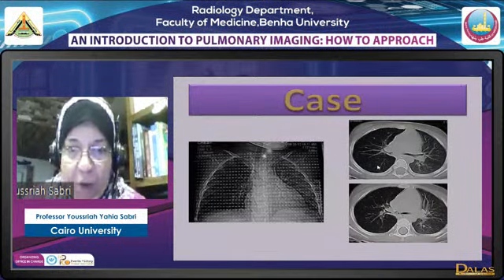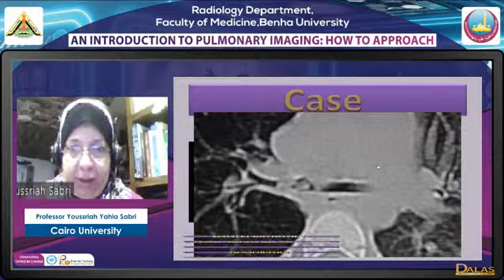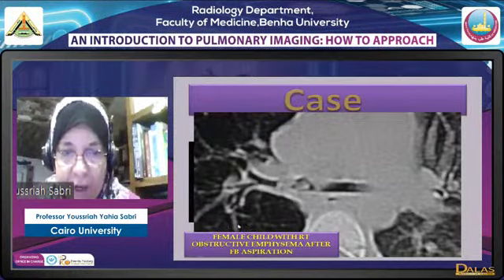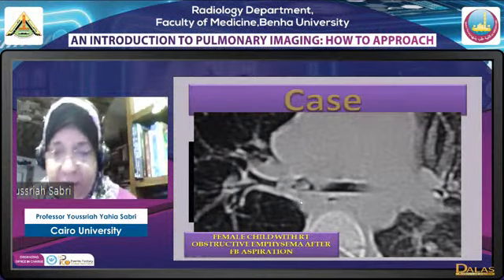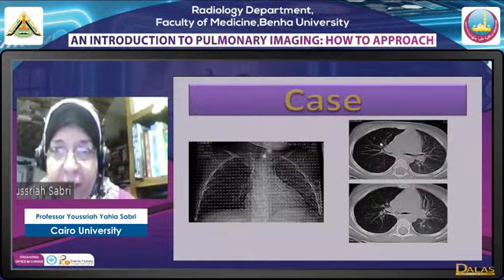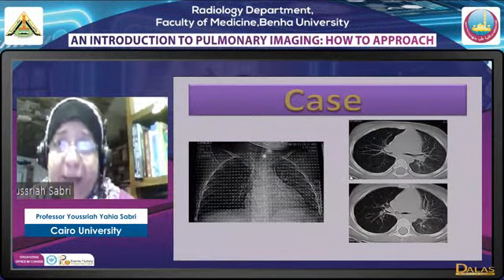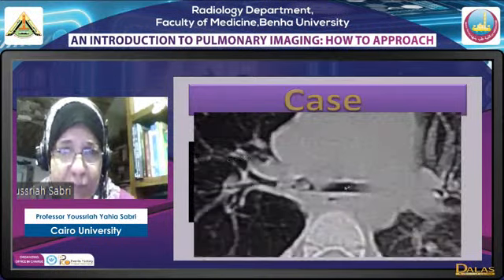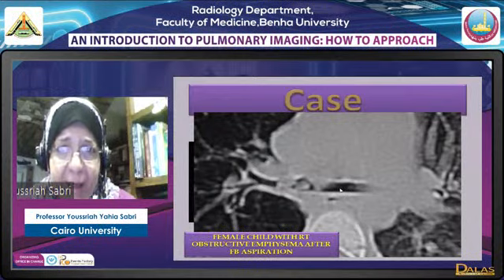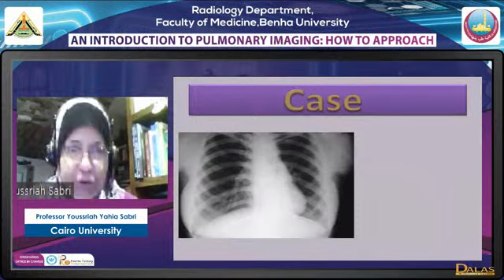We are dealing with obstructive emphysema. And in this case, we can see the peanuts. This was a female child that aspirated a foreign body, which is a peanut, and this is obstructive emphysema. This is a very serious diagnosis. In children, it could be due to foreign body. In adults, it could be the early sign of a bronchogenic carcinoma. A big black lung with no evidence of compensation.